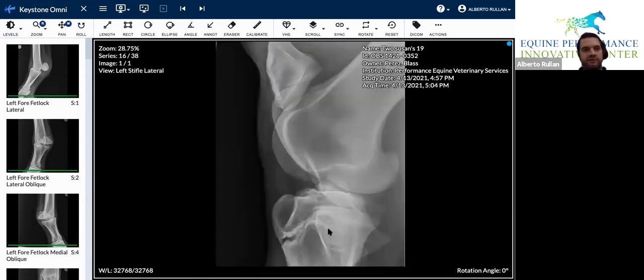All right, here we go. Stifle. Stifle has always read the femur, lateral trochlear ridge, which can get OCD, proximal lateral, medial trochlear ridge, I apologize. Medial trochlear ridge, which can get OCDs and lucencies, mid trochlear ridge, distal trochlear ridge. Now the lateral trochlear ridge, we're going right here. Same thing, proximal, medial, mid, distal. Patella, you can get spurs right here in the patella. Tibial tuberosity line, growth plate, perfectly normal. Then over here we have the proximal tibia. That's all you're gonna evaluate on this view.